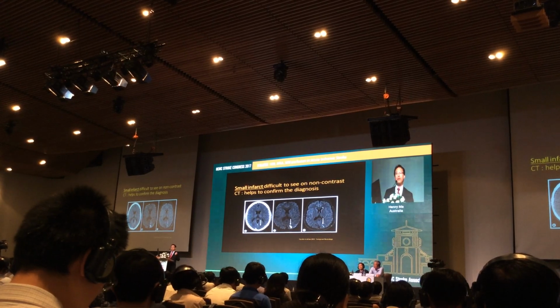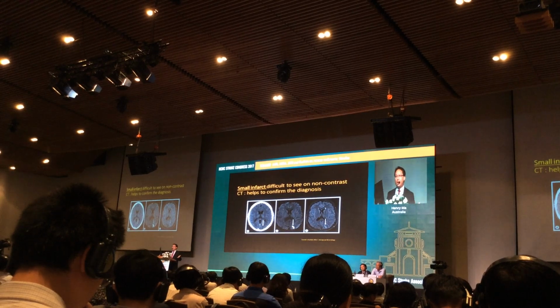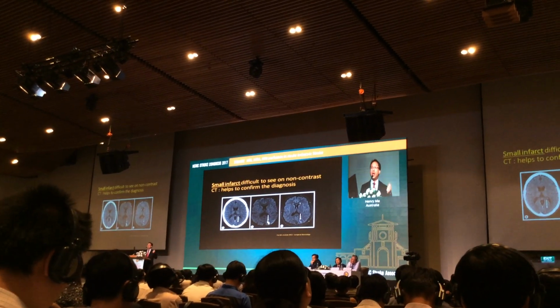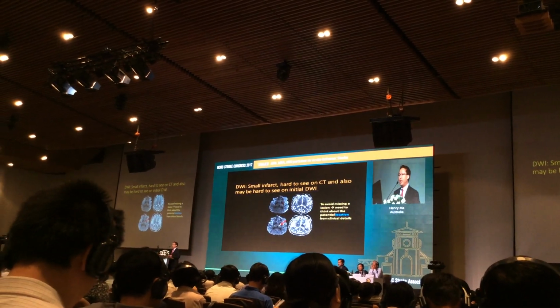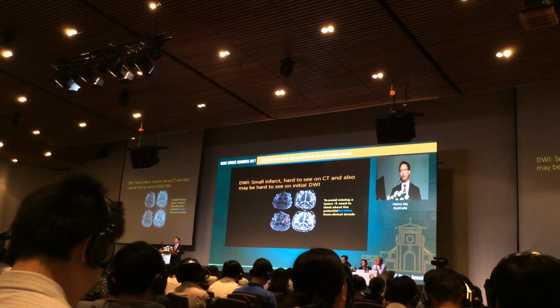With a T2, 3 minutes. So that's a very rapid scan you can do. And quickly, suddenly, you've got the diagnosis. This patient is real, has got an ischemic lesion. So that's why it's useful. Now, sometimes very early on, they can be very, very subtle and small.